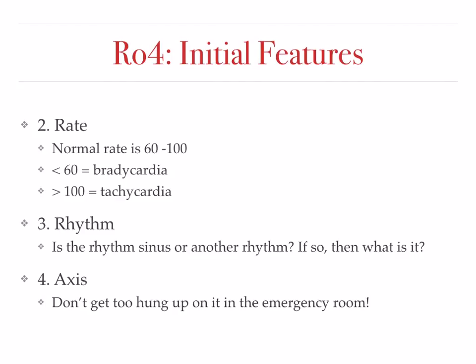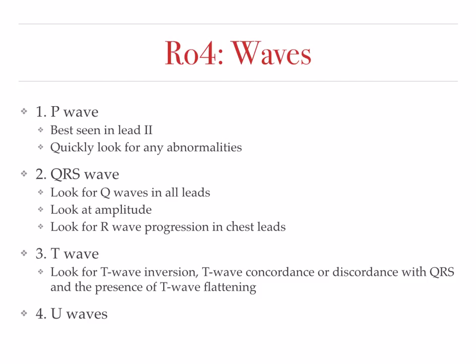Is the rhythm sinus, or is it a different rhythm? If so, then what rhythm is it? This is extremely important to pay attention to in the emergency department, as an irregular rhythm can be a matter of life and death. The last feature we need to take a look at in this category is going to be the axis. It's really not that important to get too hung up on this in the emergency department. Just make sure that overall it's in the right direction.